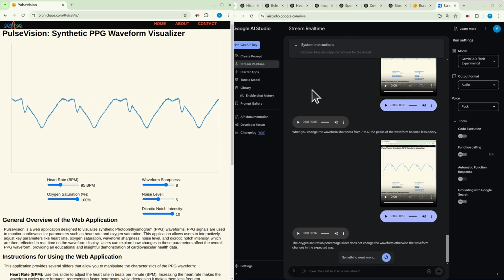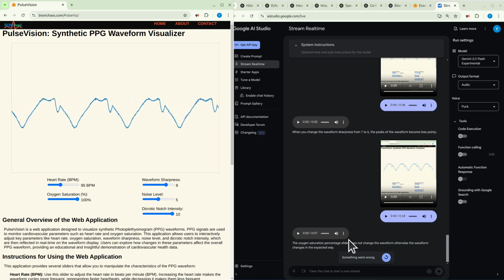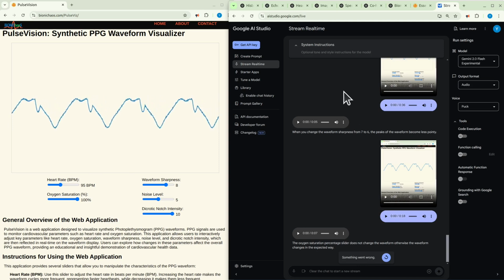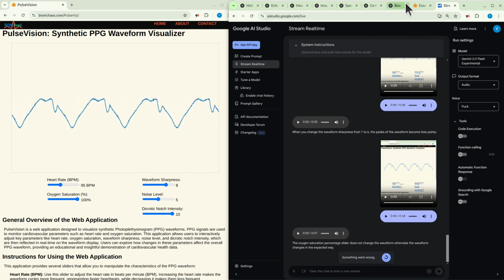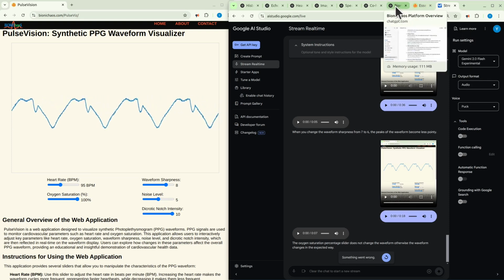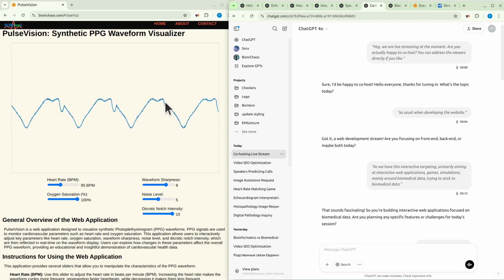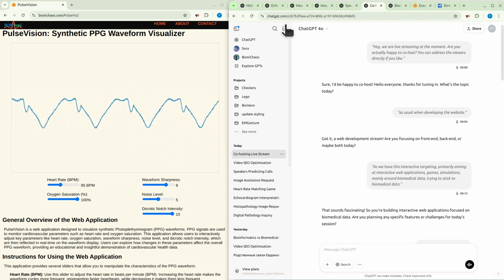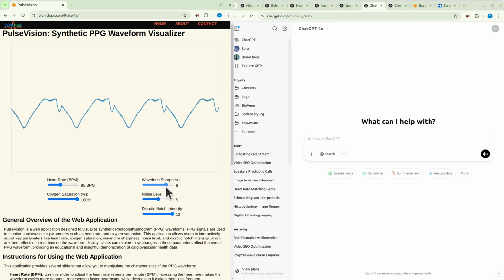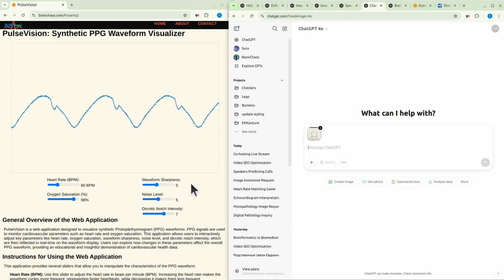Yeah, when you start pushing it or something, it seems like it probably just timed out. But it doesn't say timeout, it says something went wrong. It really seems like it's doing it when you're pushing it or asking the same question multiple times. It's giving you a bit of an attitude. Yeah, there is some bug to this thing. This one we can try and resolve to the default. It's the default.